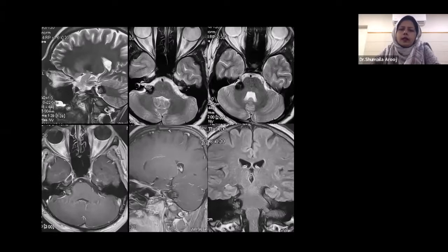He had a lot of work using headphones and things. And whenever he used to place headphones, he used to feel more ringing pain. So when we imaged the patient, we could see that there was a bubbly kind of lesion in the right CP angle, which has a T2 hypointense rim and multiple bubbly cystic areas inside the lesion. So we looked at the susceptibility weighted images, and there was complete dropout on this. So basically, this was a cavernoma.